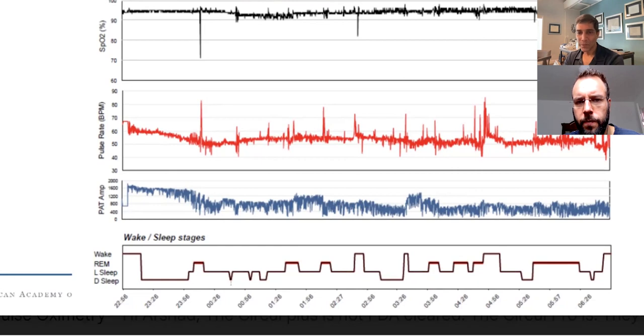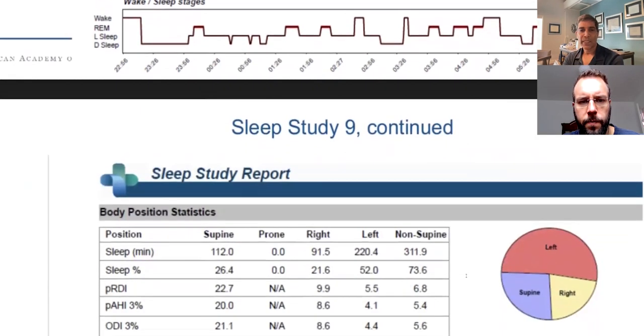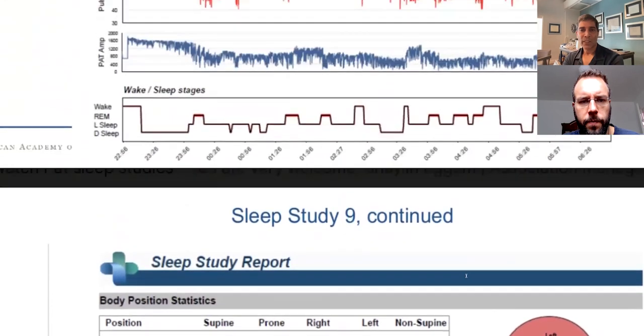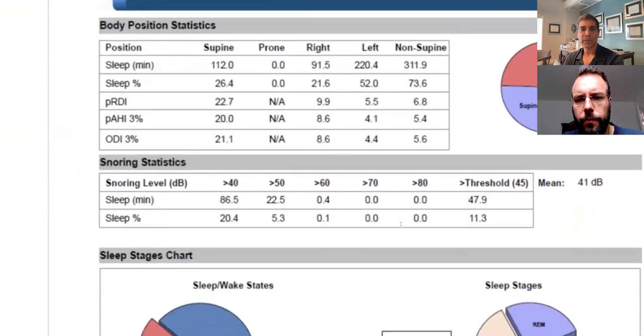And the deep sleep, when it's achieved, is very minimal. It's short. Then they wake up once, twice, 3 times, and that's it. So they woke up 3 times during the night. Out of those, actually only 2 of the 3 were out of deep sleep.